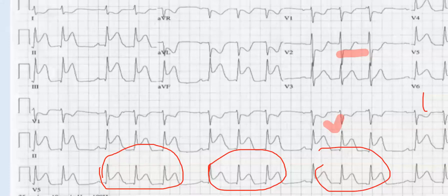Let's focus on the PR. You see the PR here? This is the PR. Now the P comes closer to the T wave, then it gets inside the T wave so we don't see it, then drops, then we start over again. So this is Wenckebach. This is inferior lateral posterior MI with Wenckebach. Okay?